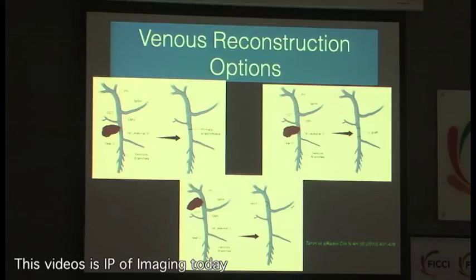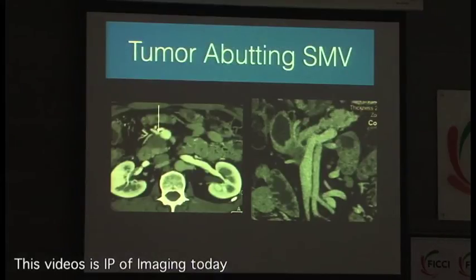Our patient obviously doesn't. So now a tumor abutting the SMV. So is this clearly resectable? It is not clearly resectable because there is abutment of the superior mesenteric vein, and that is not in the clearly resectable criteria. Is it clearly unresectable? No. So now this is a borderline resectable tumor. Now borderline resectable depends a lot on your surgeon as well. If he is confident doing vein patches and vein grafts, it is borderline resectable. If you go to Junjunu, then it is clearly unresectable.